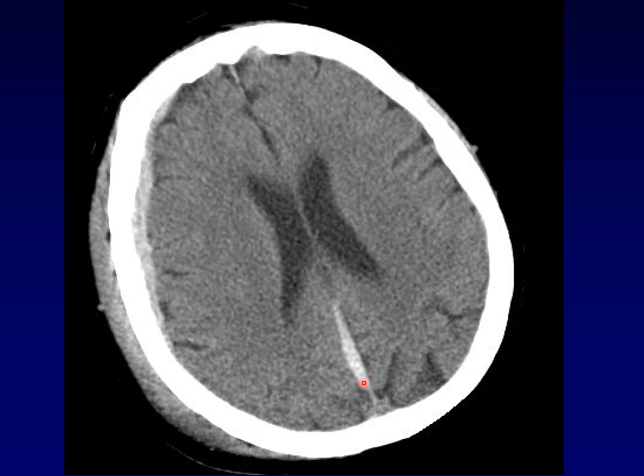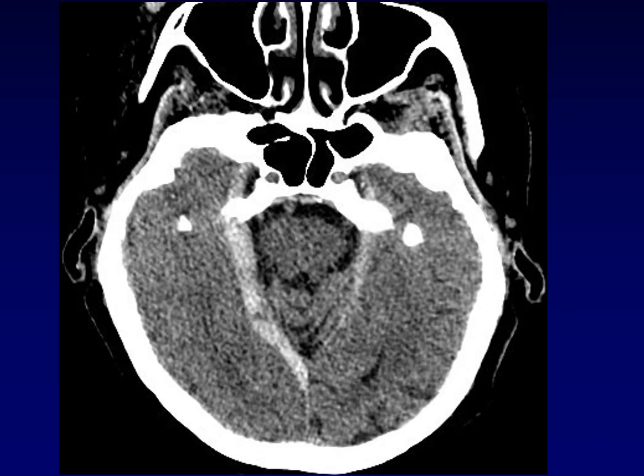Interestingly, subdural hemorrhage also can track along the dural reflections. And by dural reflections, I mean the falx cerebri and the tentorium cerebelli. So if you see blood right along the falx, that's also in the subdural space. Here's an example of a subdural hematoma tracking along the tentorium cerebelli between the cerebellar hemispheres and the occipital lobe.